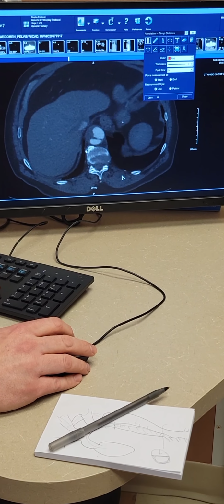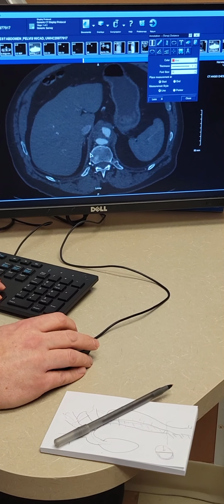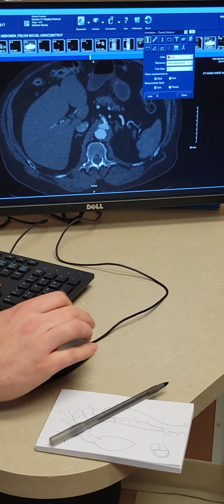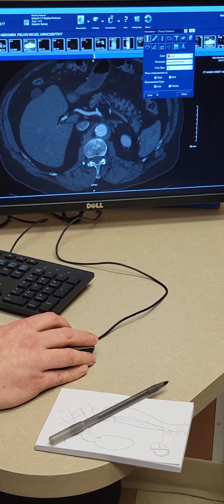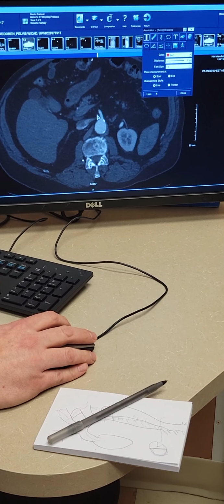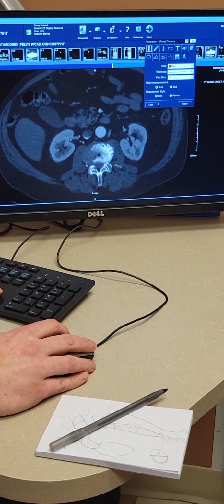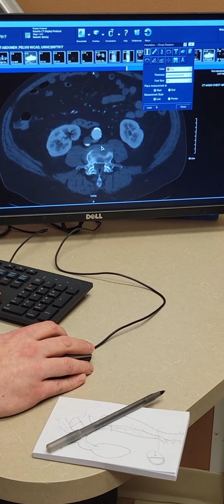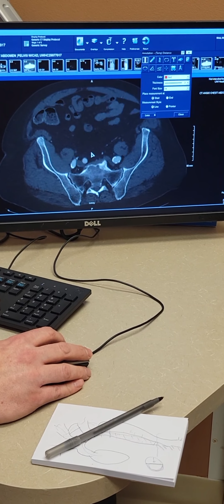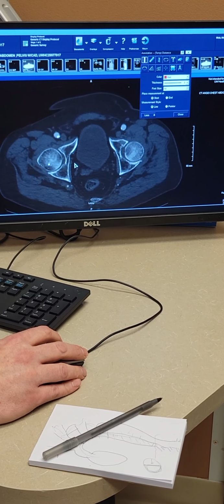And then as we come down into your abdomen here, this is your liver, your spleen, your stomach. You'll see that there's that celiac artery I was talking about in your abdomen, and then it just goes away. The dissection goes away, and now we're back to normal. That's that superior mesenteric artery, kidney arteries, there and there. And now this is down at your belly button. The arteries divide to go to the pelvis. And then these are your hips.